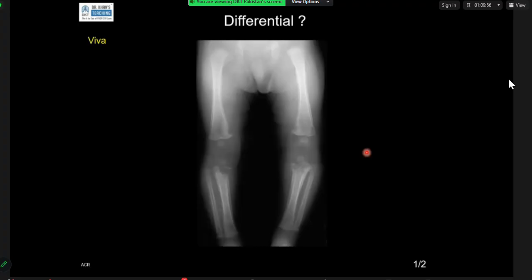Scurvy, so because this epiphysis has that Wimberger ring sign, I'll keep my differential of scurvy as well, and this periosteal reaction might represent subperiosteal hematoma. This medial pointing of the distal femoral metaphysis could represent Pelkan spur, and there's relative lucency just at the metaphysis, which could represent the Trümmerfeld zone. So yes, these findings represent features of scurvy.